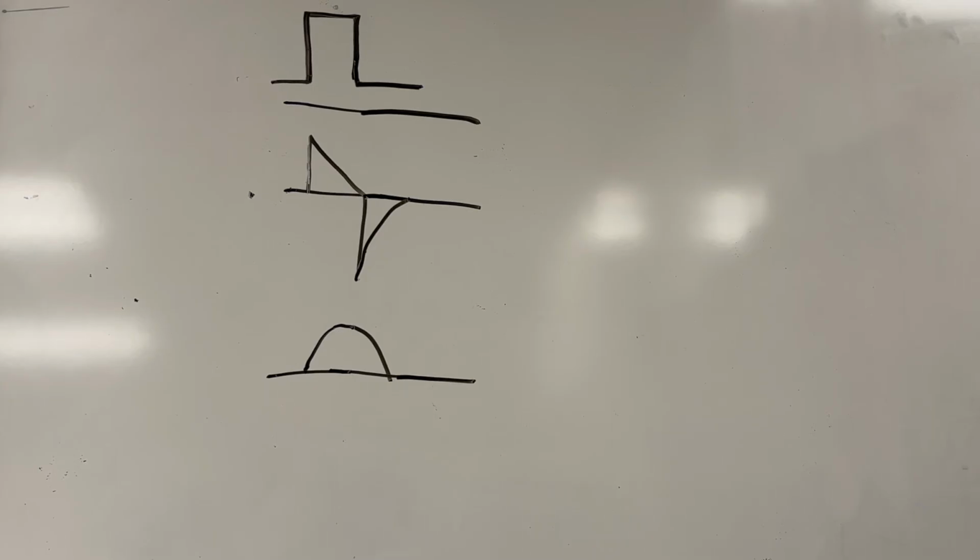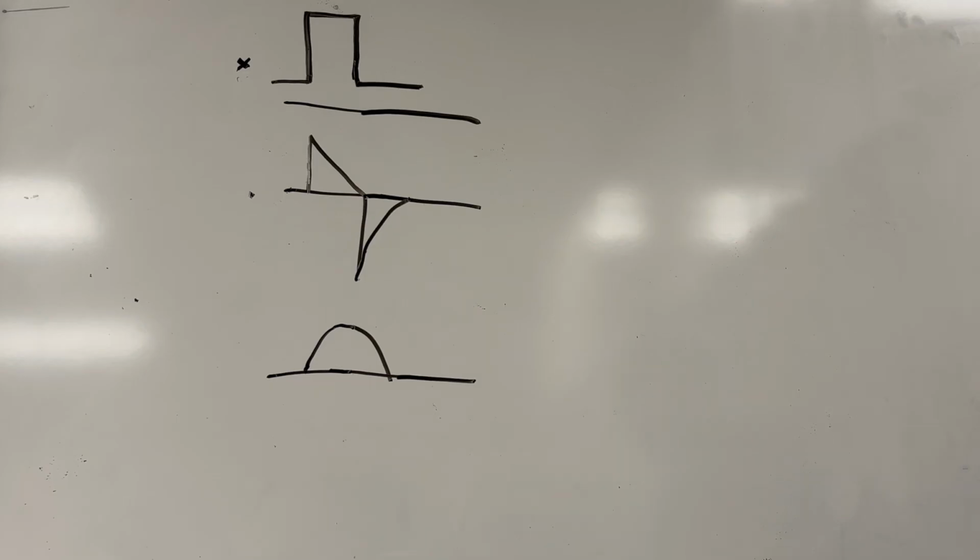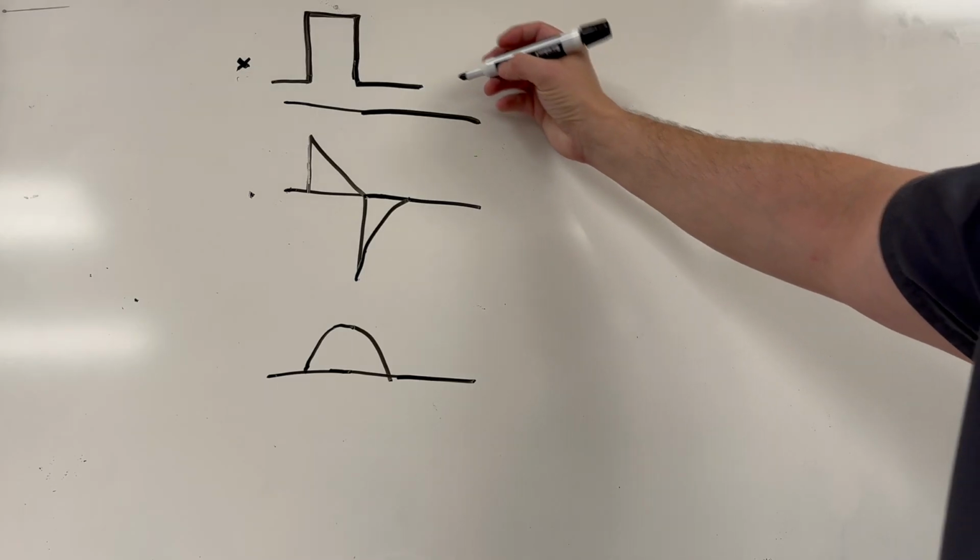If you have a patient that has an obstruction, we're going to see it mainly on the pressure waveform. Most of the time you see this, it's going to be with non-invasive patients who have a full face mask. Generally they are just in a bad position, and that's causing them to obstruct. So you would just have to go reposition them.